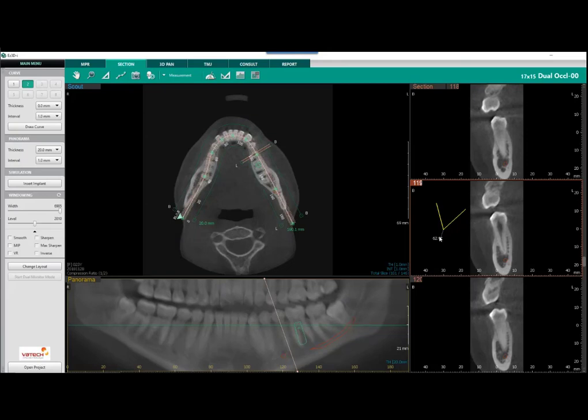If I right click, it turns off that tool. I can move this around, and I can also grab this and move this around to change my angle. We may use this specifically for abutment angles. If I place my implant, we can change this and look at maybe an angle. We can adjust our angles here, right click, and delete.